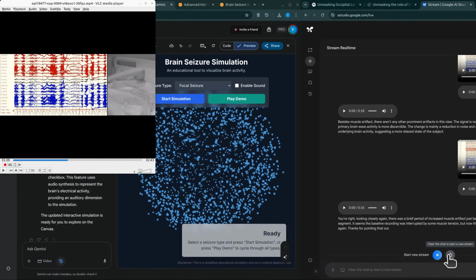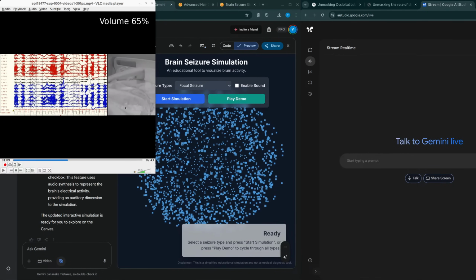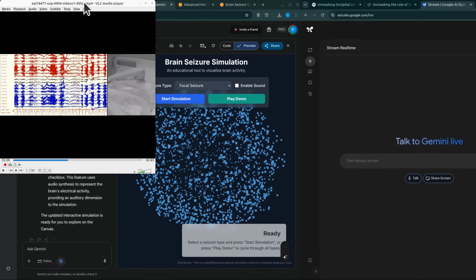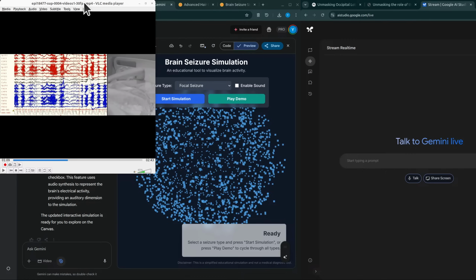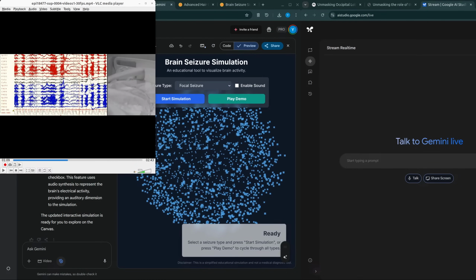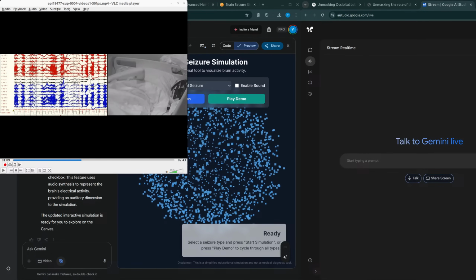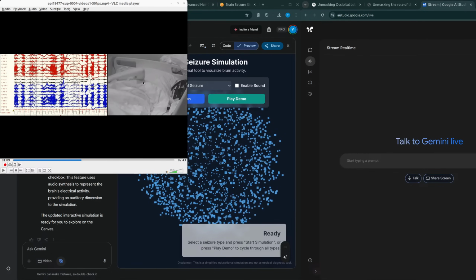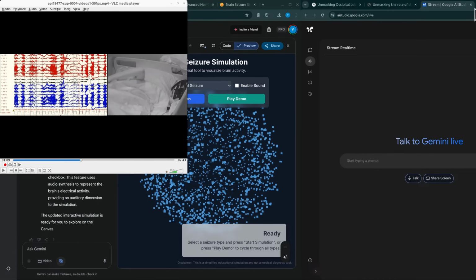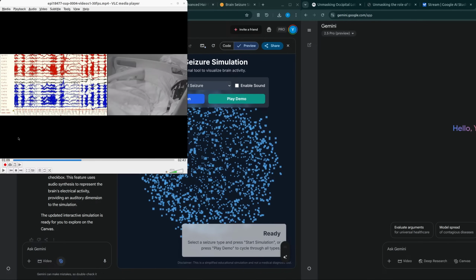Okay, that's interesting because essentially it was not able to make a diagnosis. Yeah, which is quite interesting. I wonder what it would be able to do if it had the video of the patient as well. But then some things are pretty obvious. Should be pretty obvious.